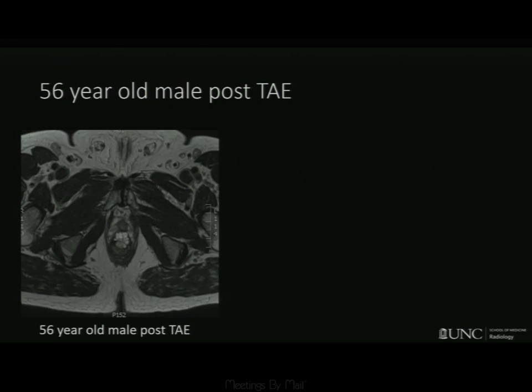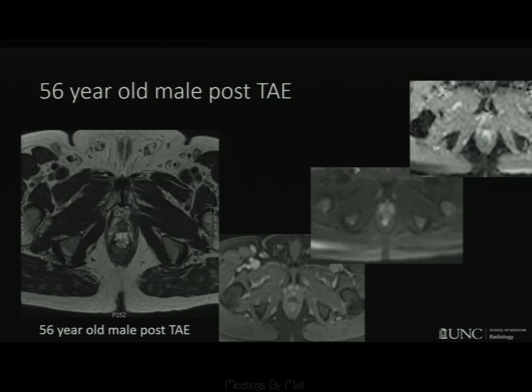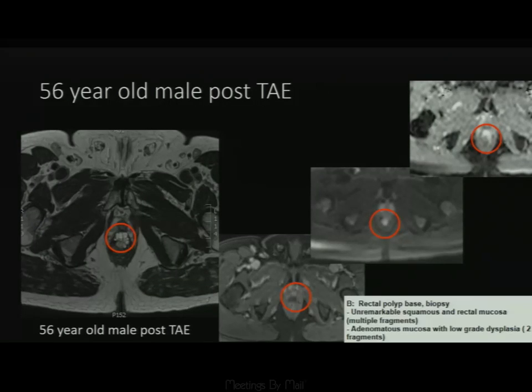We didn't have an MR prior to his transanal excision, and this was what we got, and it actually looked the same over 2 scans because, well, we actually saw him 2 scans in. But when we looked at it, we saw this focal area of restricted diffusion in here that we were concerned about, and maybe a little bit of enhancement. So then the surgeons biopsied.